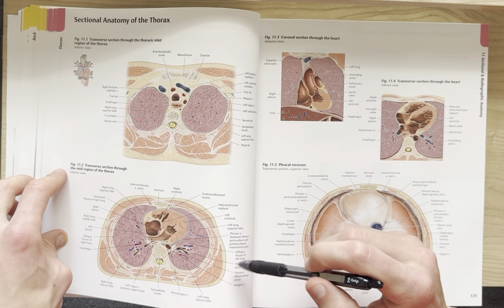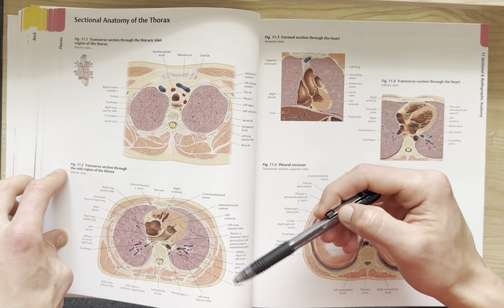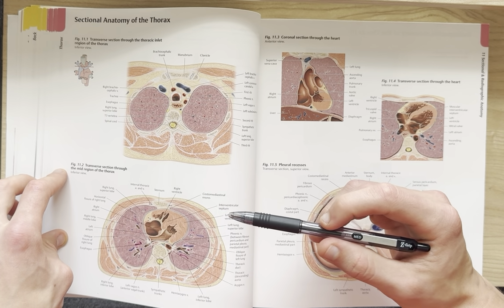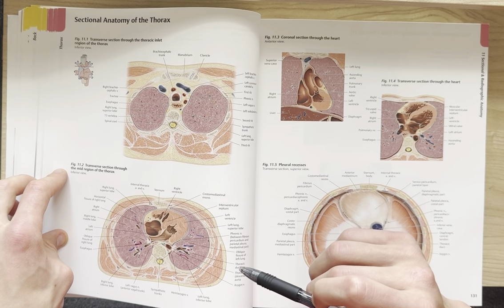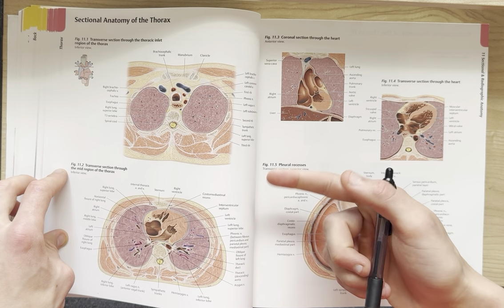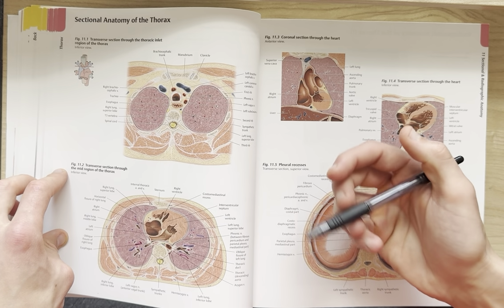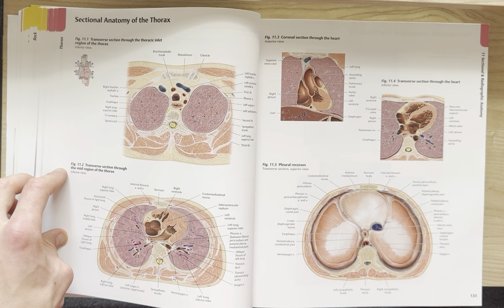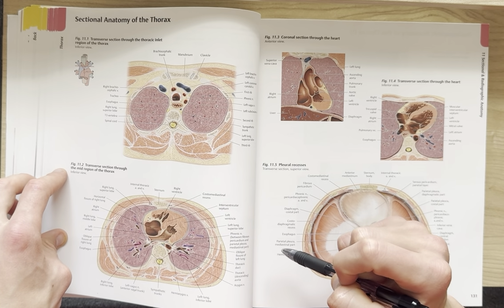But when you know the baseline anatomy, where these features are, what these features are, what they look like, whenever radiologists are doing reads on any radio imaging, you can pretty quickly, or with some expertise, dial in to see if there's anything atypical, whether that be cysts, tumors, any kind of internal bleeding, any kind of symptomology that they're trying to rule in or rule out of their differential diagnoses when they're trying to ascertain the clinical finding.